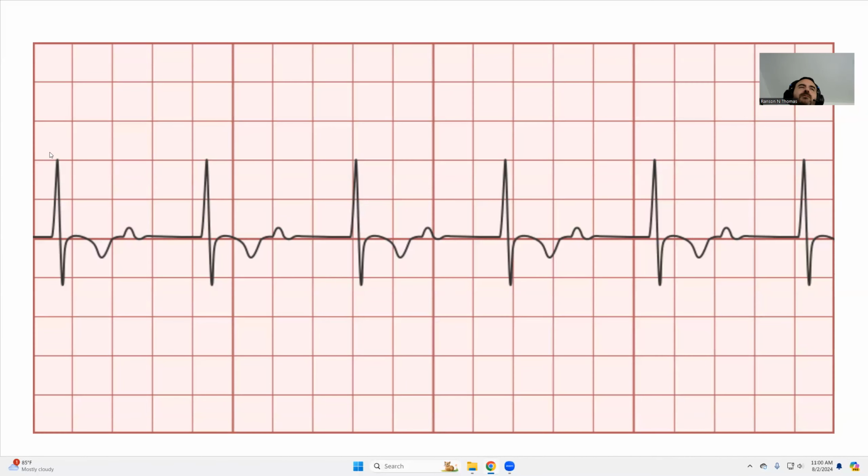All right, so picking up where we left off, if you look at this rhythm, one thing that should stand out even without the small boxes is, we'll start at the beginning, right? We see a QRS, right? A T wave that looks inverted, and that's not necessarily a problem. It depends on maybe the lead we're looking at. And then we see, look, a P wave so super close to that T wave, right? And then look at this big old space between the P wave and the QRS. This is a heart block, right? Which obviously is what we're going to be talking about.